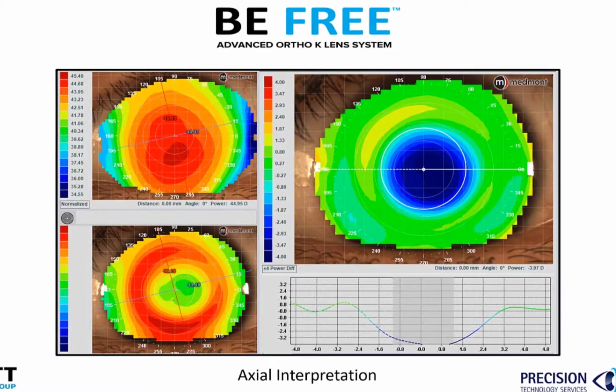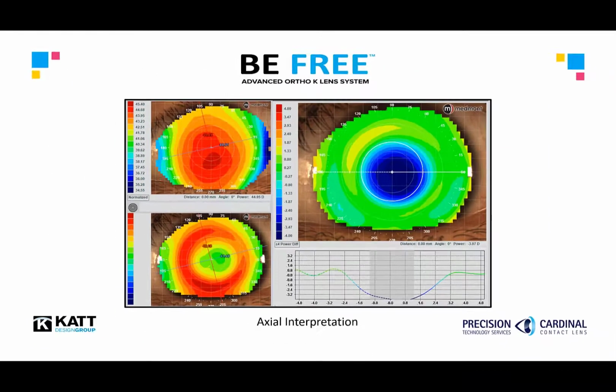The effect is positioned optimally enough to be characterized as a bullseye topographical response, the ideal outcome following overnight wear. The axial subtractive map provides an interpretation of the power changes and resultant visual effects the treatment creates. In this case, we would expect the patient to be quite pleased with the visual outcome based on this well-centered bullseye topography.